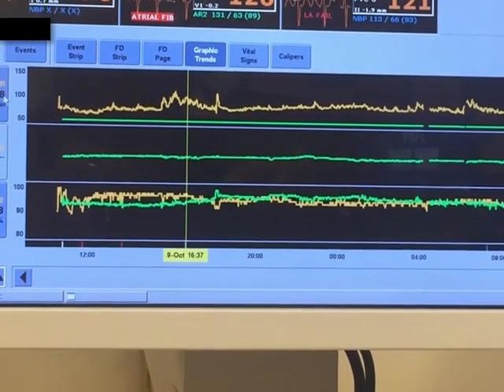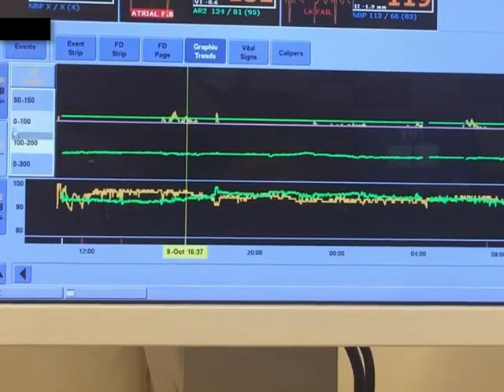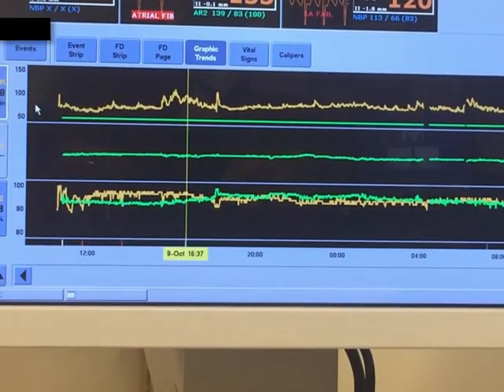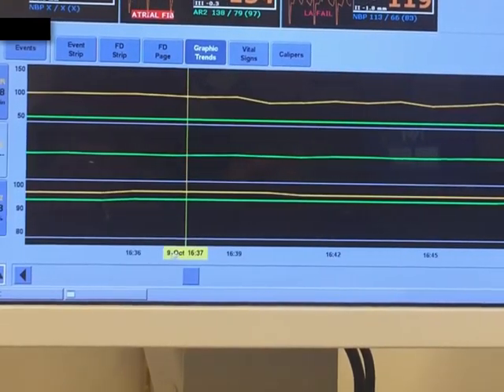The heart rate can be changed to different ranges that may make clinical sense based on the patient's baseline heart rate. Additionally, the time range can be changed to reveal the heart rate trend over as little as 15 minutes or as long as 24 hours.